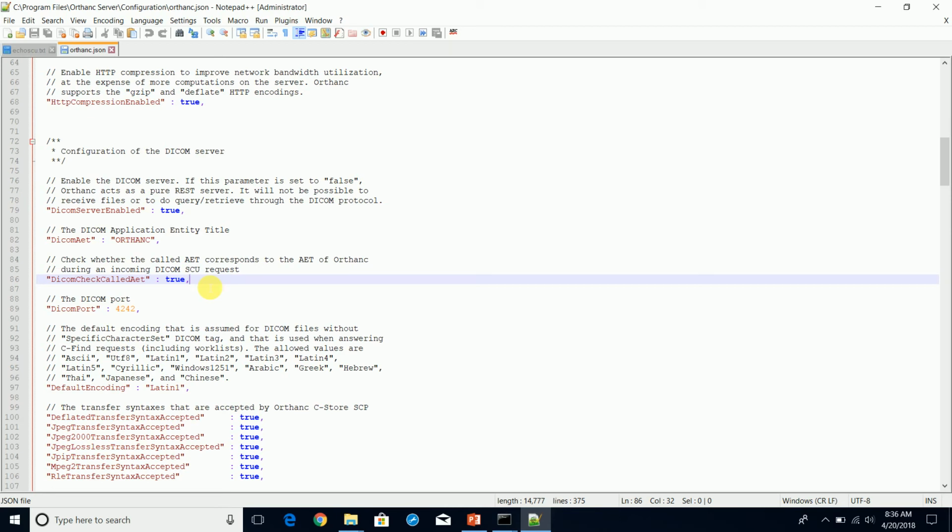When we make changes like this, I forgot that I had to restart the DICOM service. And after that, we saw how we can put these logs to file, and we can check the contents. We can do details. We can just do info. So this is all good, useful information, and it's also good for troubleshooting.